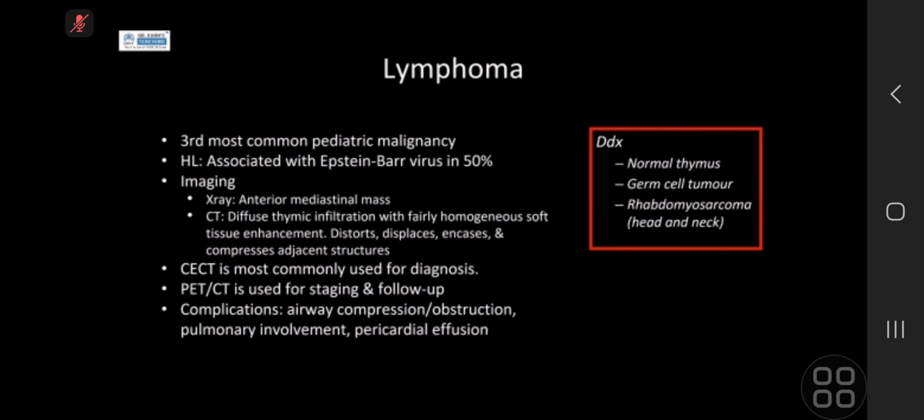So something that we do is use ultrasound to differentiate whether your thymus is a normal thymus that's just a bit big, or one that's infiltrated. Lymphoma is the same as in an adult, the way we use CT to diagnose. So we don't really go to MR unless we think that this is not lymphoma. And the reason we didn't think it was the other differentials you mentioned is because it's quite homogeneous and we didn't think it was particularly avidly vascular.